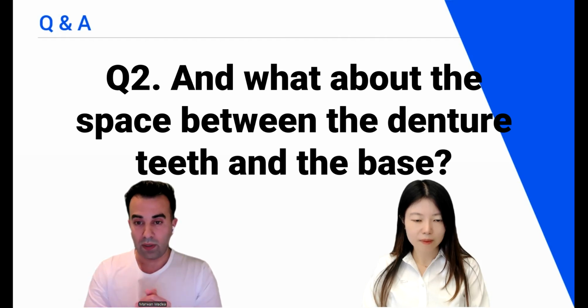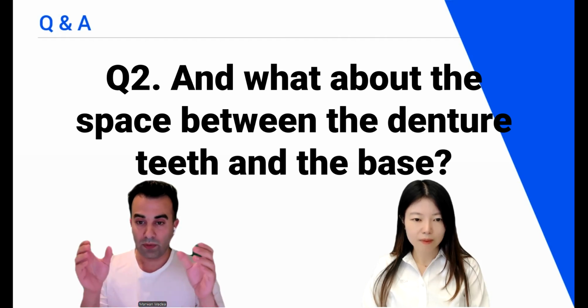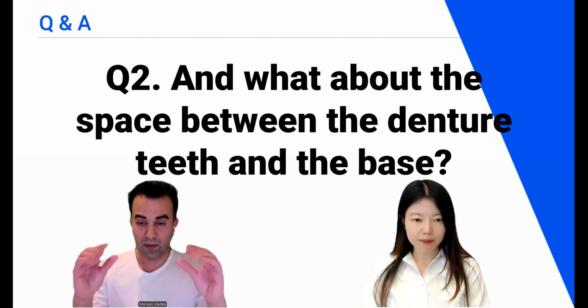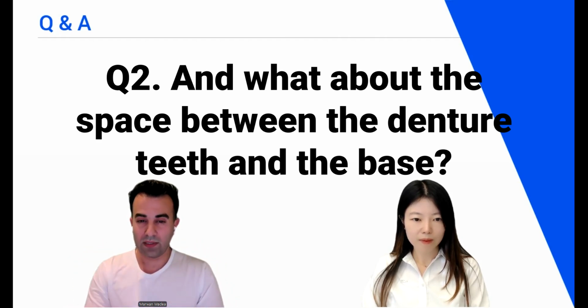It's not a must to leave a millimeter. All we need for teeth retention within the socket of the denture is just a bit of the root area, so we can leave more than 1 millimeter. It depends on the case. However, in this case that I demonstrated, I did leave a millimeter, and it seems to be good for this case.